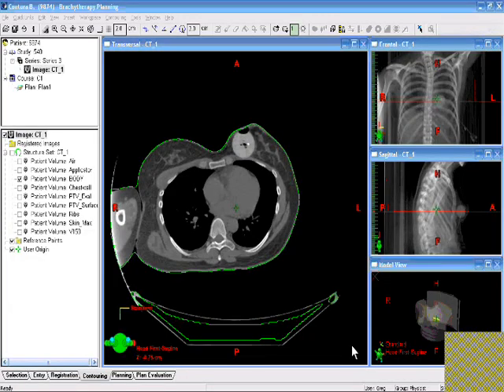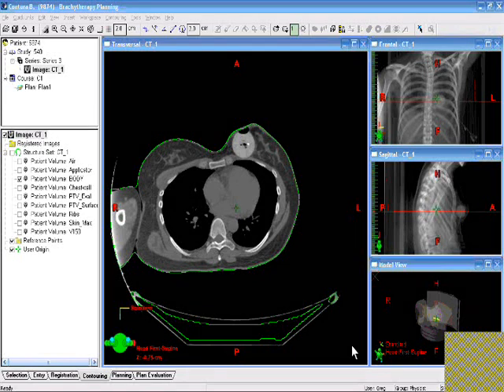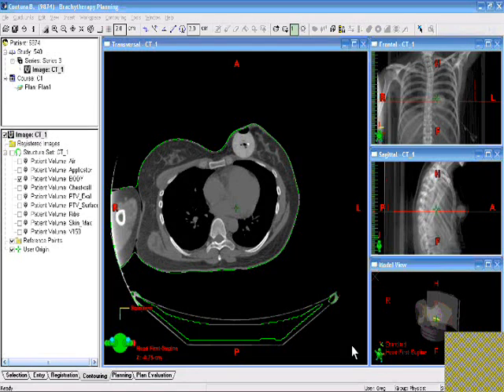Welcome back, everyone. This is the second in a series of Contura patients. This one's going to be a little bit more difficult, and we will make the assumption that you've gone through the first case before looking at this one, because we won't be describing every bit of the reconstruction on this case, because there are some more interesting features to talk about.